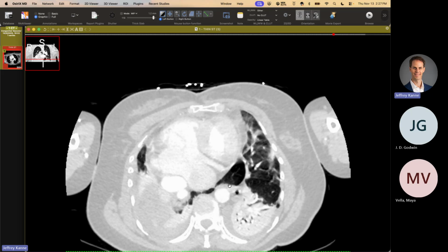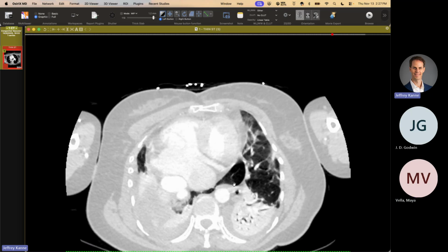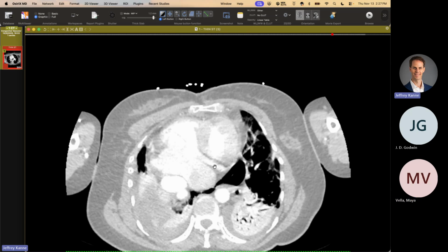So this is the so-called, quote, horseshoe lung. It's not a true horseshoe lung because they're not fused, but it's passage of a portion of usually the right lung into the left hemithorax. But because there's intact pleura here, it's not a true fused horseshoe lung. And we've seen this in a couple of scimitars. Interesting.